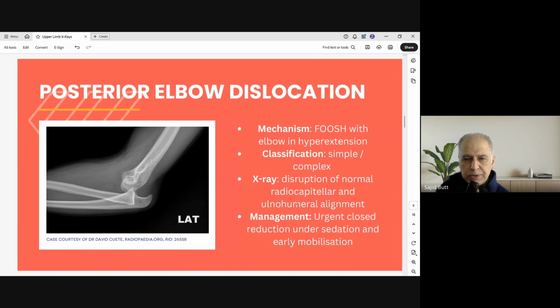Here's an example of a posterior elbow dislocation. When you're describing dislocations, it's the relationship of the distal part of the joint which you have to count. So because distally, the olecranon has clearly pushed itself further posteriorly, that would be called a posterior dislocation. And it's the triceps pull which does the trick. Hence, posterior dislocation is more common. In order for this to heal, obviously the dislocation has to be reduced, and then the patient treated in a sling. Next slide.